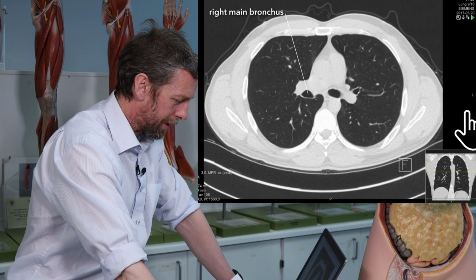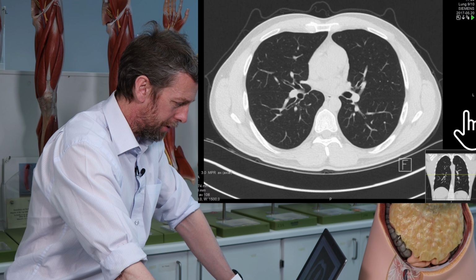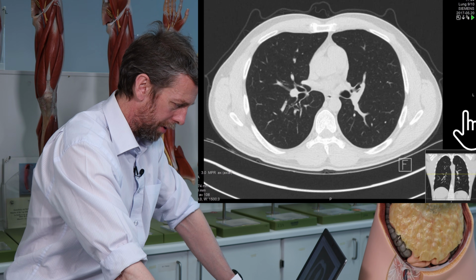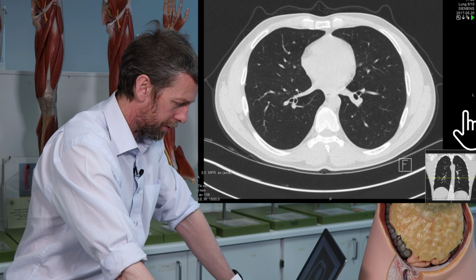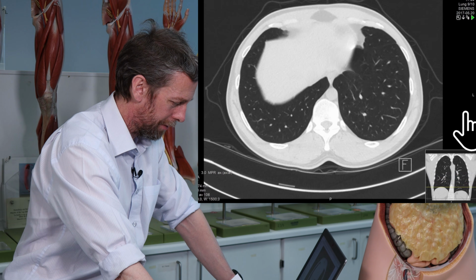And then moving towards each lung, and then as we continue down, you can see more branches, so the lobar branches, and so on, and then they get so small that they disappear and become part of the lung.